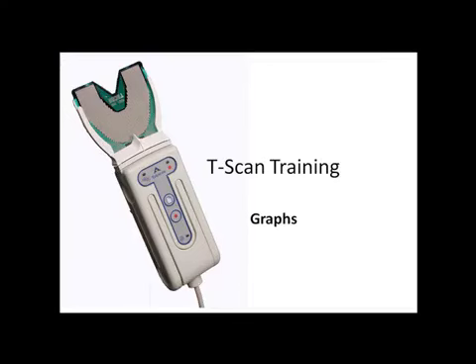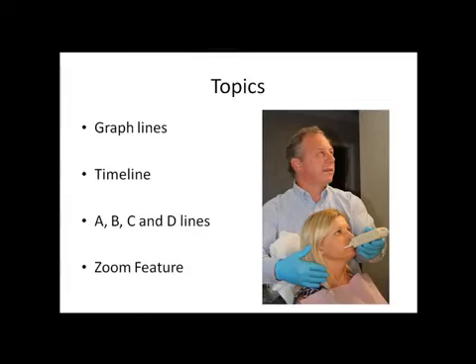TechScan presents the T-Scan training video, Graphs. This video will cover the following topics: graph lines, timeline, A, B, C, and D lines, and zoom feature.